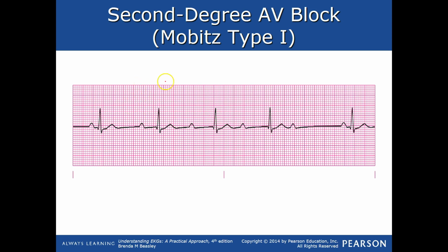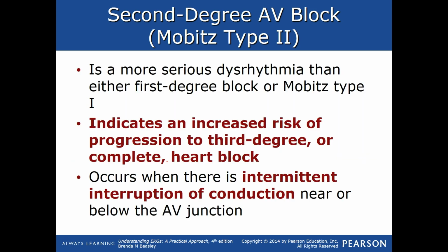One last one. So we see we have normal here. See how it's lengthening, and then this one is lengthening. It just keeps getting longer, and then, wow, got one missing right here. So going, going, gone.